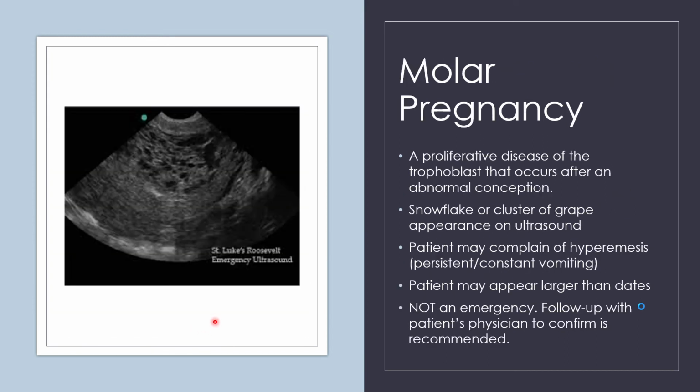Molar pregnancy, again, not an emergency. We would want to follow up with the patient's physician, but the reason I've got it in the slide is because if you see lots of gunky stuff, okay, this is known as a moth-eaten appearance or a snowflake or cluster of grapes.